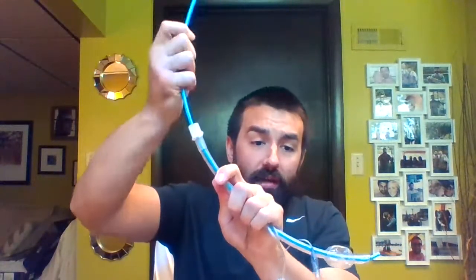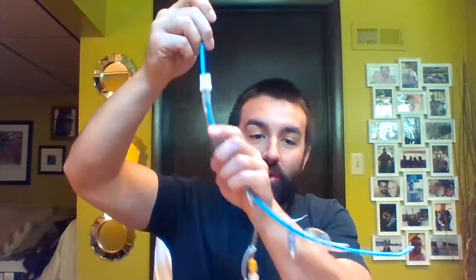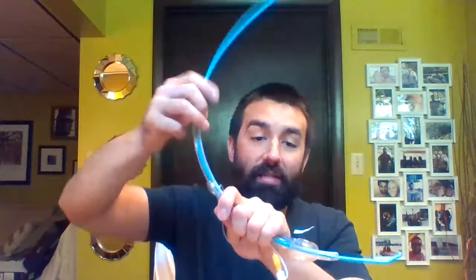So the bougie, there's a couple of other fancier versions, one called the Frova that allows you to hook up oxygen. This can be used as a difficult airway device, so we can use it to help intubate when we're having trouble seeing the cords and getting down through there. We can use this for exchanging out an ET tube. If we had somebody with a blown cuff, you could push this down into the trachea, you wouldn't want to stick it out the end like that, and then have somebody slowly deflate the cuff, pull it up and out of there, and then you load another ET tube on and slide that into place. You don't have to worry about trying to re-intubate and not getting it. It lays the tracks for you to follow.